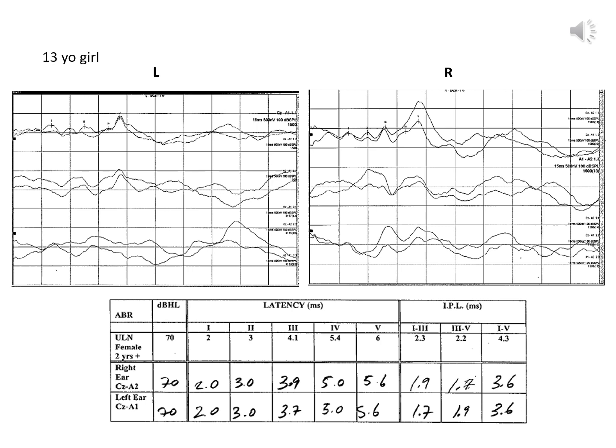And so you'll see the right ear and the left ear panels recorded at 70 decibels. And so what is striking immediately from these is the amplitude differential between wave 1 and wave 5 in both ears. The wave 5 is of a normal amplitude, whereas the wave 1 is much, much smaller than the wave 5, more than 50% smaller than the wave 5.